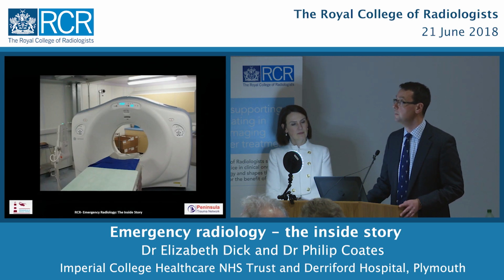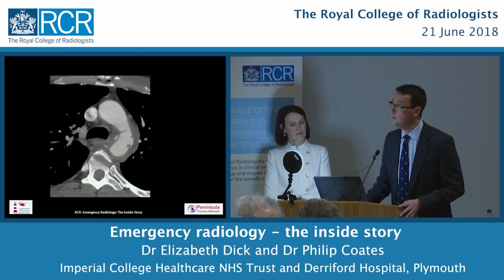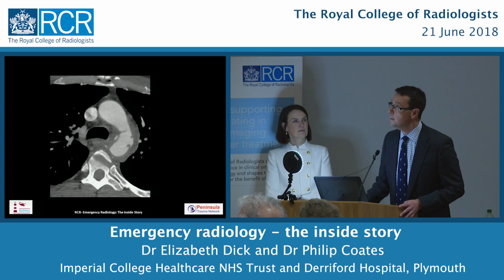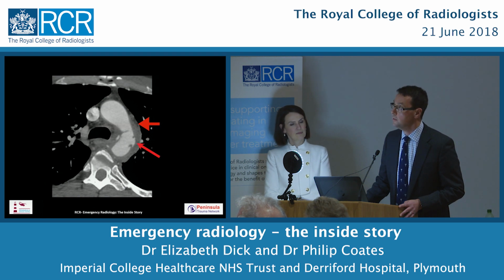He's going to go and have a CT scan. And the CT scan reveals a quite catastrophic thoracic spine injury at T11, which explains the paraplegia, but that's not the full story with this patient. His blood pressure is unstable and he's got chest pain. If we look up at the aortic arch now, so we're up in the chest, that's not quite right. This stuff around the white, dense, contrast-filled aorta is hematoma. There's evidence of leakage there, and next to it, that isn't quite right as well.